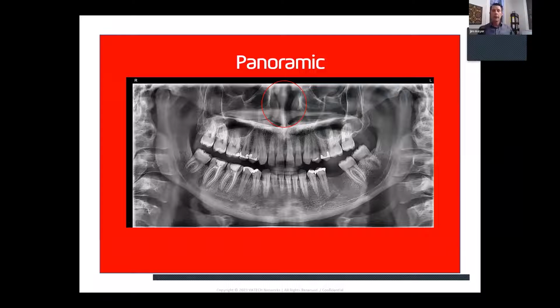And we're going to look at this more in the cone beam, because we have the same cone beam specifically for this panoramic here. The floors of the maxillary sinuses, and the right and left mandibular canals and mental foramen, which is located between the roots of, and apical to the roots of, the mandibular premolars. And we can appreciate also the airway, which is projected bilaterally.